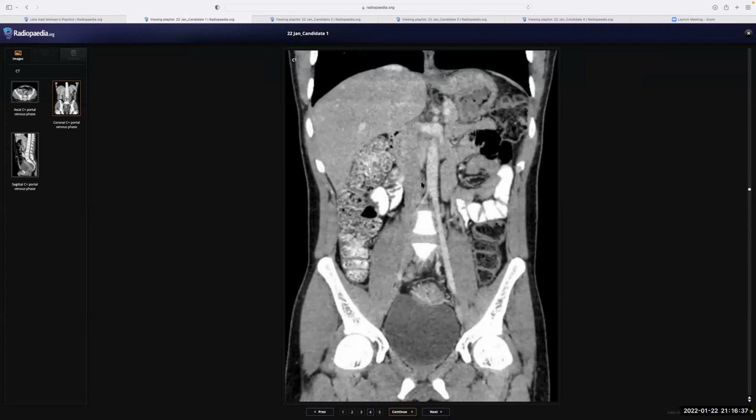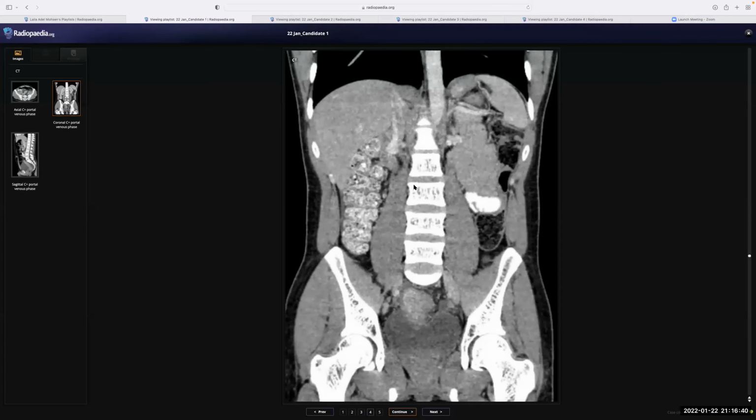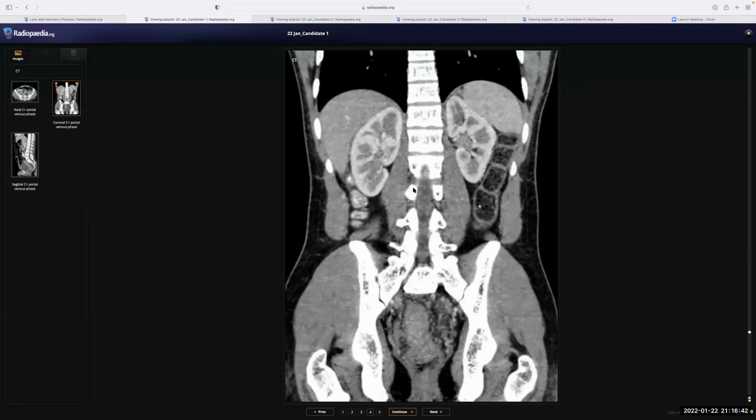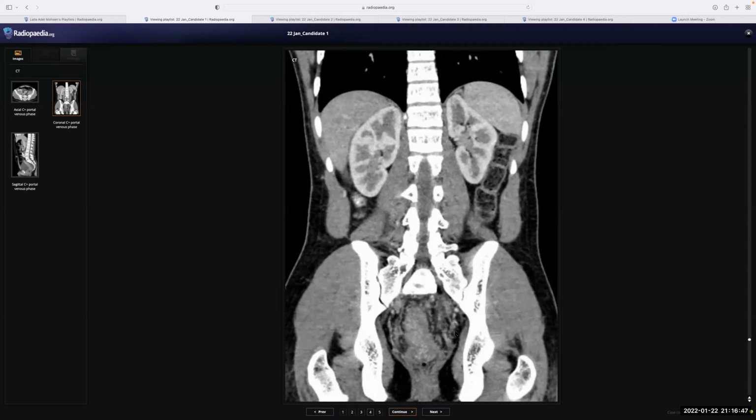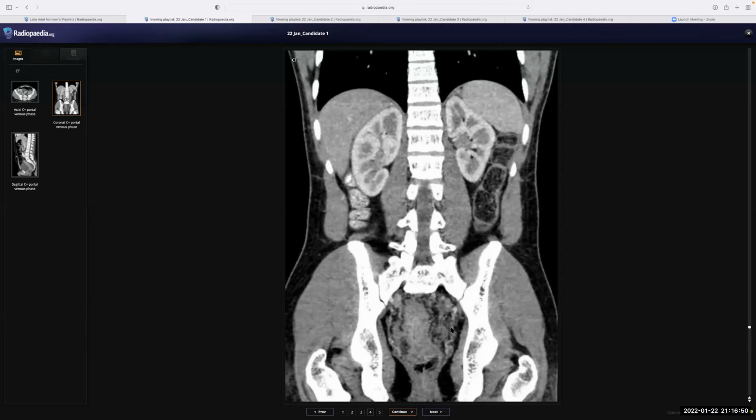Okay, so can you summarize this case? So to summarize my findings, there is a thickening of rectum and proximal sigmoid, which is suspicious for a malignancy with some perirectal lymph nodes. So I will convey my finding to the referring clinician and further with lower GI MDT, colorectal MDT discussion, and then CT chest as a staging should be undertaken. Okay, so next case.